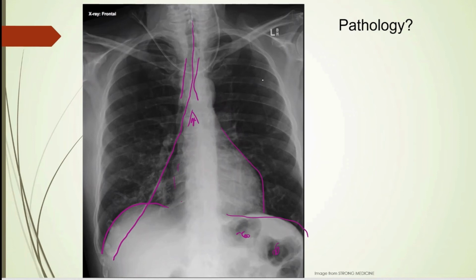And then E for everything else. Looks like there's good vascular lung markings all the way out. This is scapula. Don't mistake that for pneumothorax. And I had the advantage to be able to use my iPad to make this image larger because it's difficult to see, but there are lung markings out there. If you have an iPad, you can make this bigger and see those markings as well. Just have to take my word for it. So pathology here looks like they have an NG tube down in the right lung and needs to be replaced.